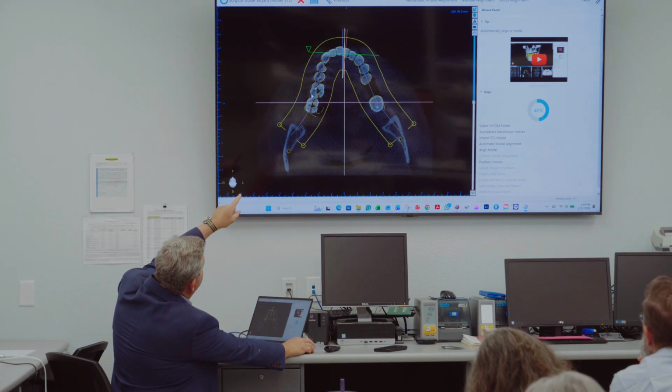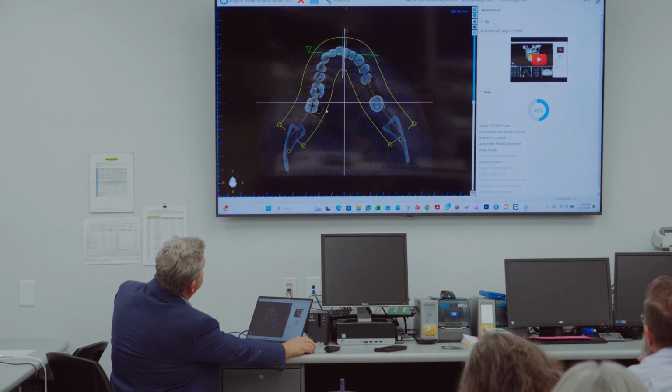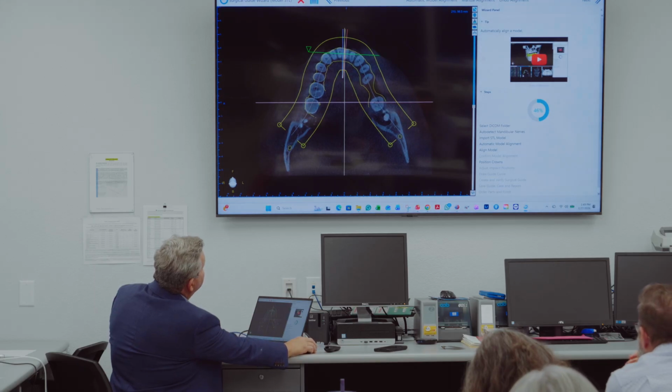If not, you can also look, as Corey was telling earlier, you could look through here and see how this outline matches the teeth. See that? The STL is the yellow, and the tooth obviously is the white. And you can scroll all the way through this, and that's a really good registration. Okay? That's one way to look at it.